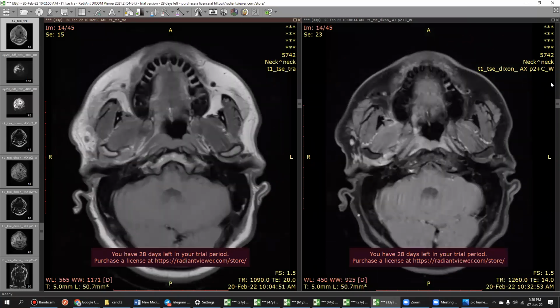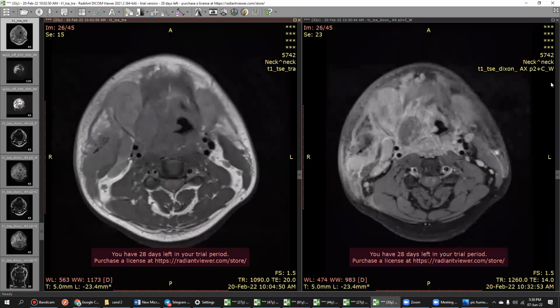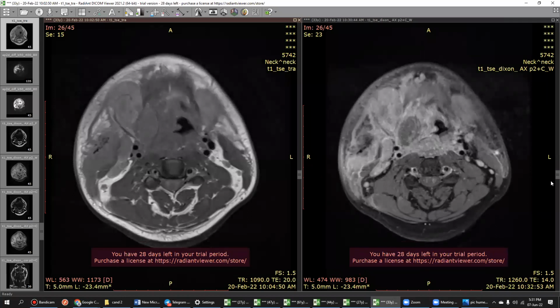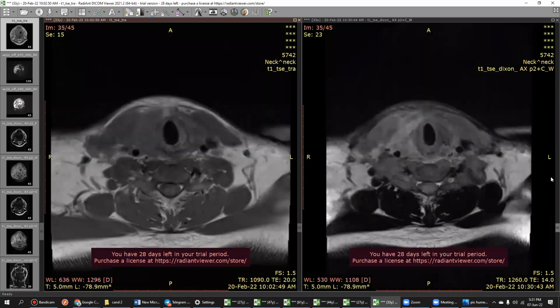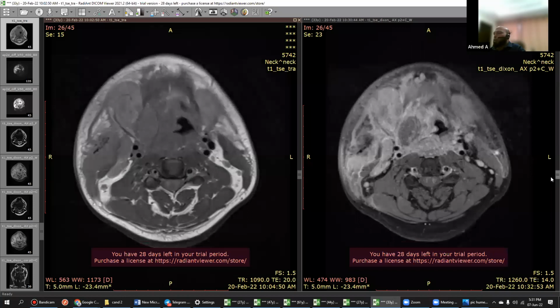I can't delineate the abscesses here. I can see some necrotic areas within the solid enhancing tissue. Is this an abscess or a necrotic area? Yeah, it can be an abscess also, because it is very diffusely extended, so it can be infection.